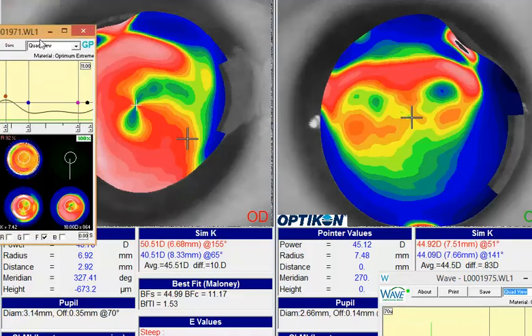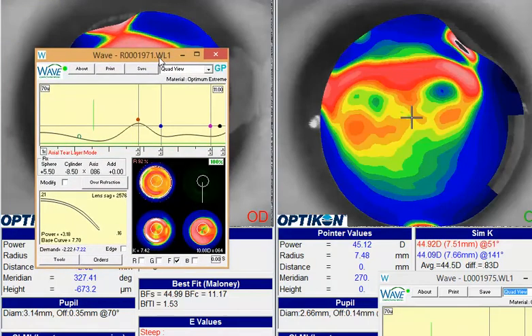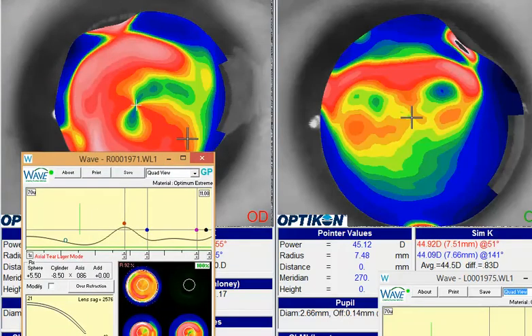So right away that's going to give you a lens that's highly accurate on an inaccurate topography. So what I like to do when I do a new design is not average the astigmatism on these corneas, and I'll show you in a moment what I'm talking about. The next thing you want to do is you want that lens to capture as much corneal data as you can. So quite often I'll try to get this back surface OZ red dot somewhere along the inner edge of the red, and then the blue dot I'll probably split the difference on the red, to try to create a little more landing zone. So I did a little mock-up here on a lens. I'll see if I can bring it up here for us.